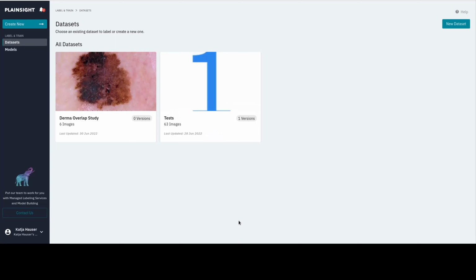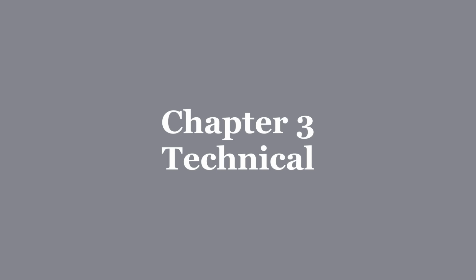We request you to annotate the following images with explanations. The diagnosis, whether it's a melanoma or a nevus, is going to be provided to you. We found that in our pilot study, it takes around 1 to 1.5 minutes per lesion.